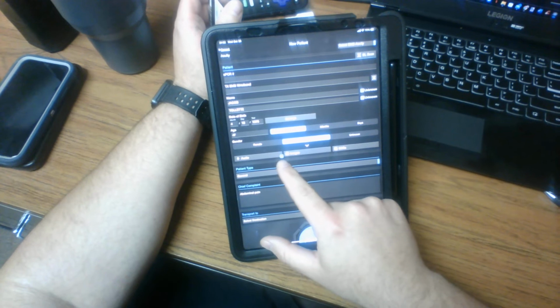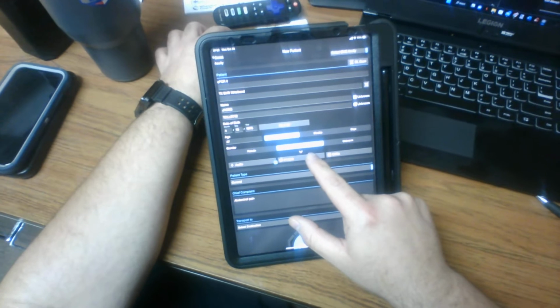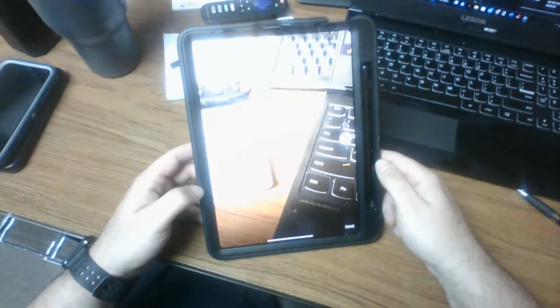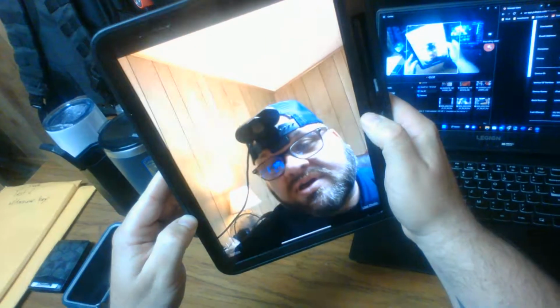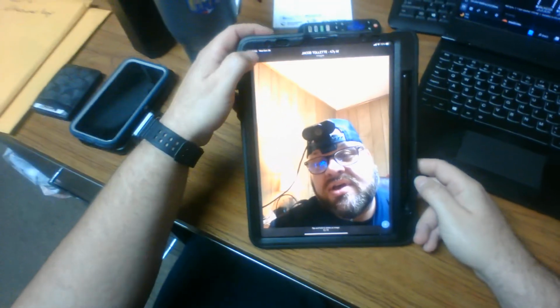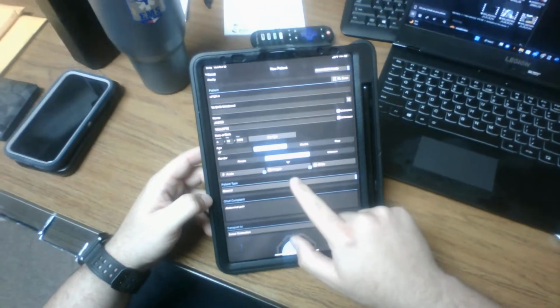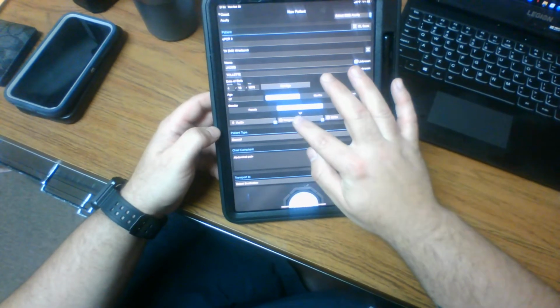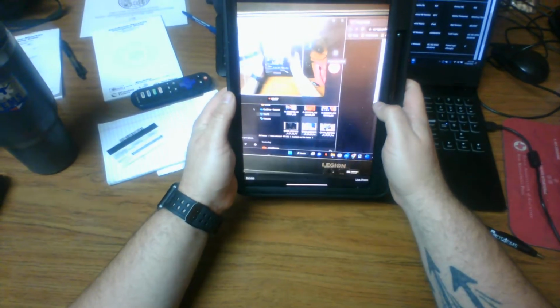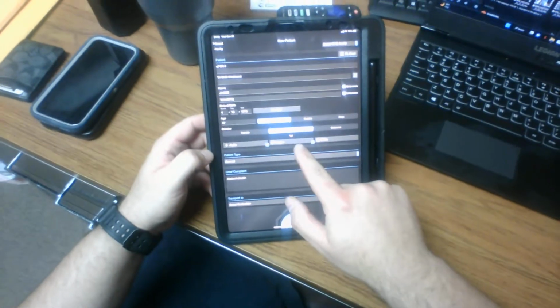Now you'll see it has added one audio file to that button. Now the next thing we're going to do is add an image. Now there's two images you need to add. You need to add a patient image, like in this case, well, you can see this stupid webcam on my face. We're going to use it, back out. Now instead of entering vitals into this thing, take a picture of your monitor. Add a picture of your monitor, which shows all your vital signs and such. We're going to use that photo, back. Now we've got two image files.